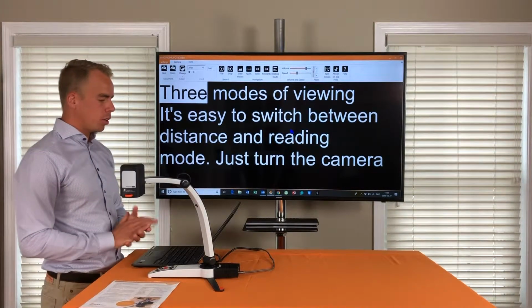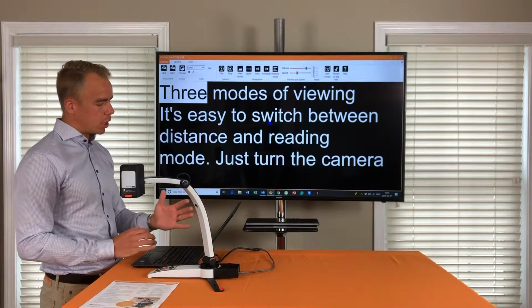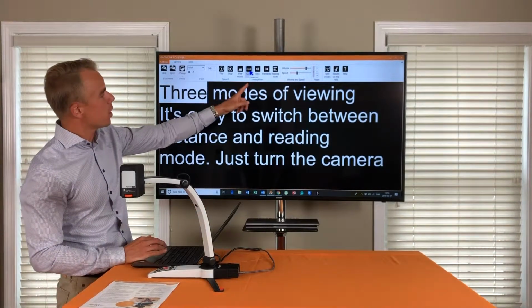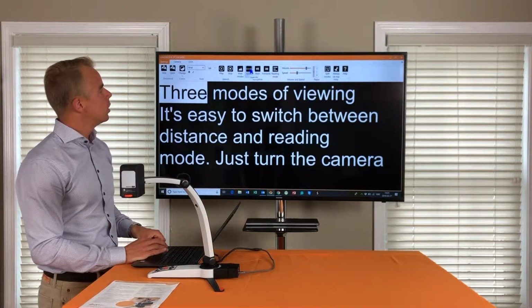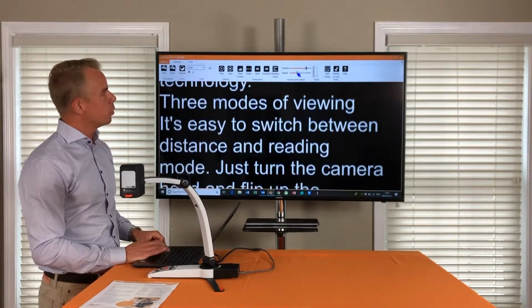Another thing that I can do also is quiet mode. I can follow along in quiet, so I will show you by pressing either N as a short command on my keyboard or this icon up here. And I will follow along in the text. I can make it slower.